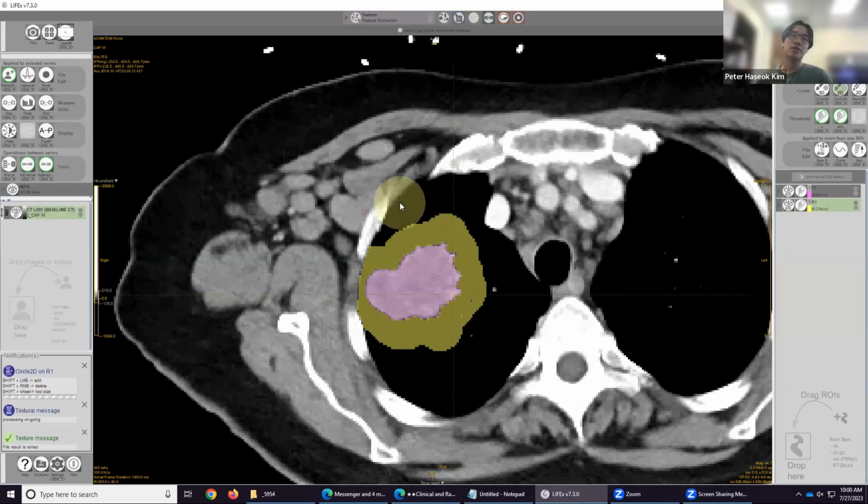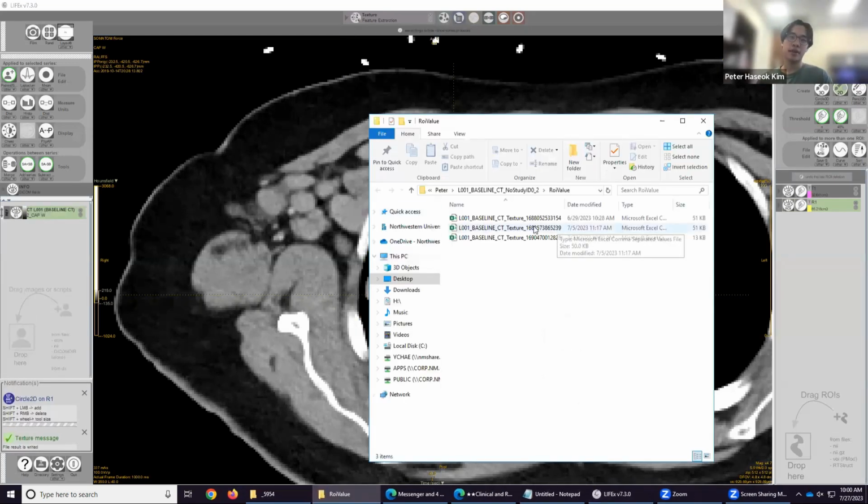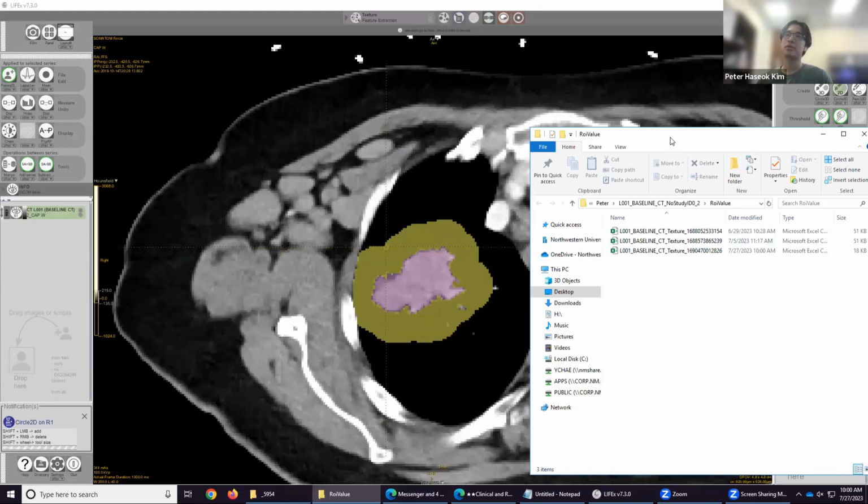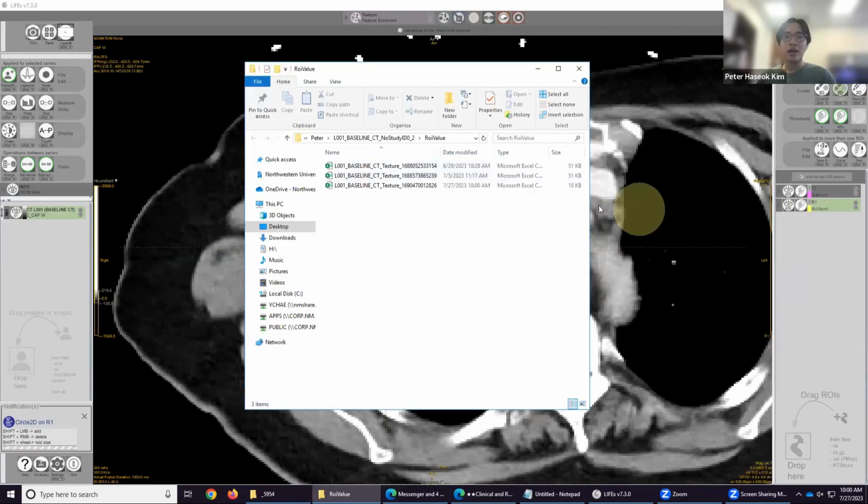When you run it, it's going to take a bit of time. Also your segmentations might look very shifted. Don't worry, it'll go back if you just scroll. Wait a couple seconds when it runs, because sometimes if you click into the Excel sheet too fast, some of the ROIs haven't finished computing. If it hasn't finished computing, you can always close it, delete the Excel file, and run the texture again. Today is the 27th, so this is the file that I just texturized. We'll open it.